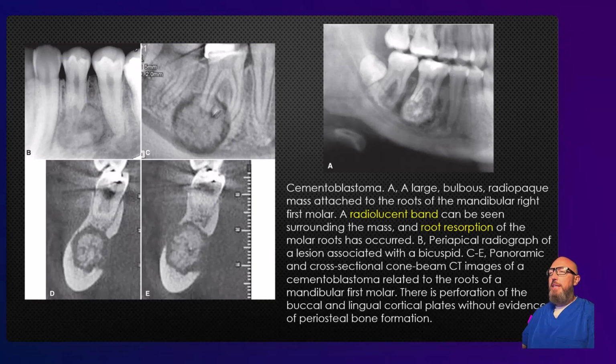band around it. This is from a sagittal slice in a CBCT, just of note. And then these are from the coronal slice or the cross-sectional slice. But now we can see the cross-section of that bone and see that it's kind of resorbed through the buccal and the lingual cortices of this bone, and that nice round appearance. What I like about CBCT and 2D imaging is they look similar in both, right? That nice round appearance. In this case, we'll talk about the radiolucency as the hypodensity around it. And then this one, I think, really shows best that spoke wheel appearance. So that's nice. Sometimes you can see the appearance of the resorbed root, but it's attached there. There's no PDL space around this. There is a radiolucent rim that kind of varies.